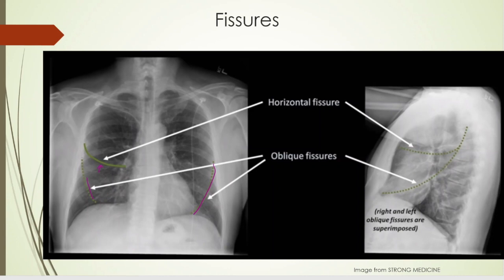If you are able to pick them out, then start thinking along the lines of excess fluid in the lungs. Or sometimes you can pick them out if they have a really good consolidation infiltrate that's really defined in one lobe, like the right upper lobe, right middle lobe, which is this area here. This is right lower lobe. Of course, this is right upper lobe. And left upper lobe. Your lingula is in here, but we'll talk about that a little bit later. And then your left lower lobe.